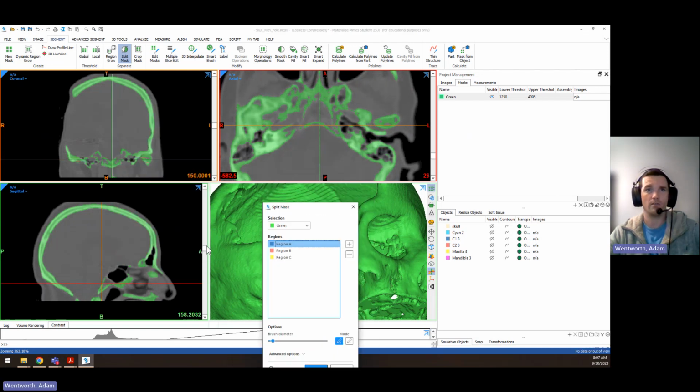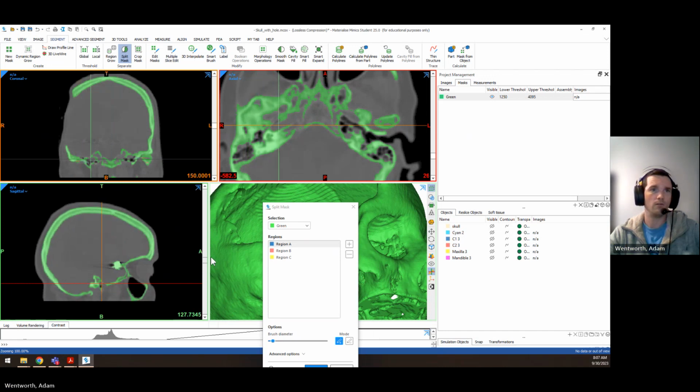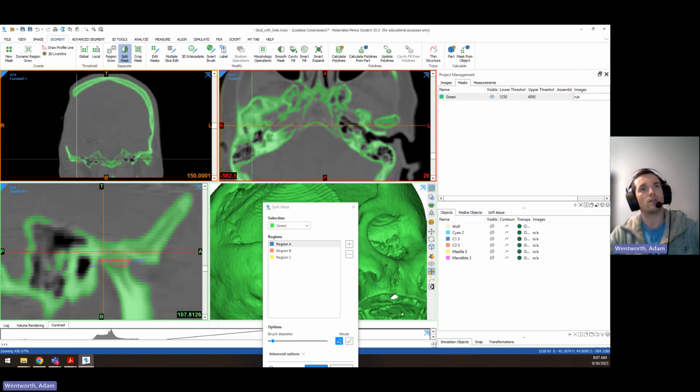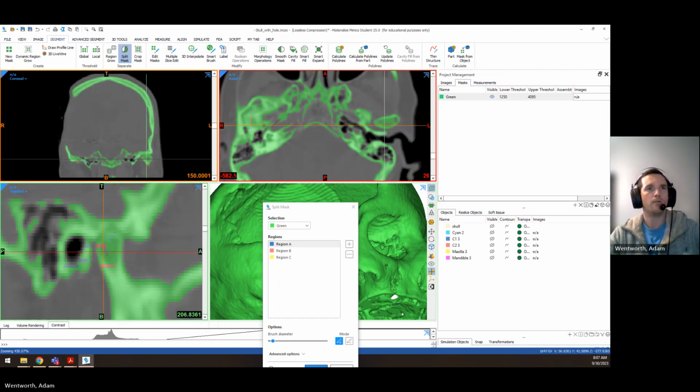You can do the sagittals and stuff too. But the computer is pretty good at figuring out where those things start and stop. And the slices here are pretty thick, so yeah, something like that. And the more overlap you have, probably the more you want to mark.